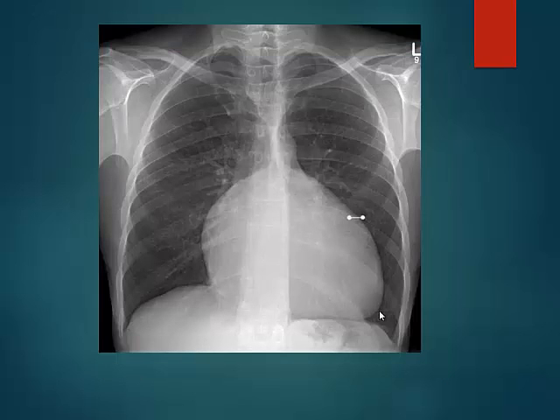Okay, this patient, young female. So there is again here a prominent left heart border, right ventricular enlargement. First of all, the overall heart size is much enlarged, much dilated. Then there is the prominent convexity of the left heart border, indicating right ventricular dilatation. And this one, right atrium dilatation. So if you see both right atrial and right ventricular dilatation, which conditions would come to your mind?